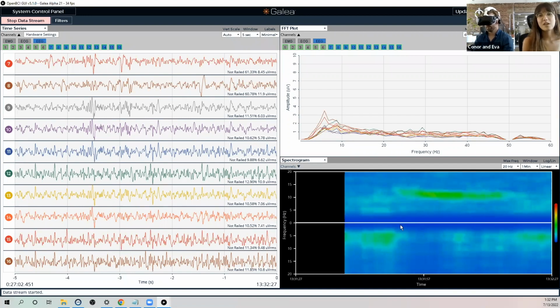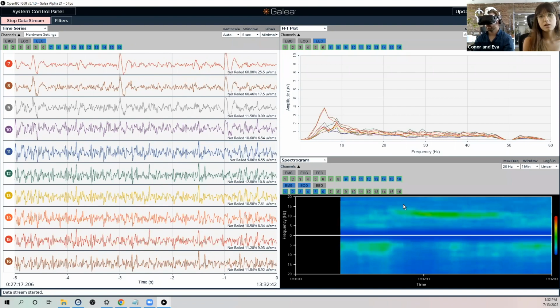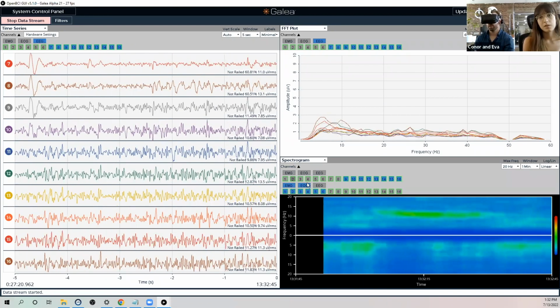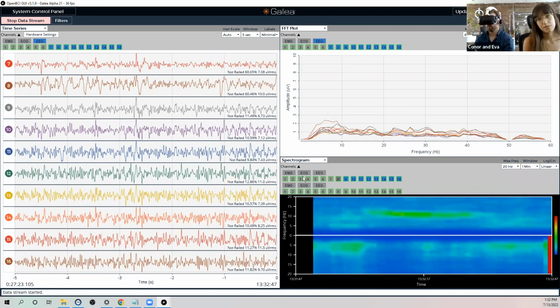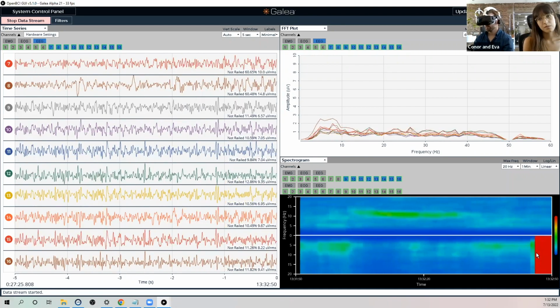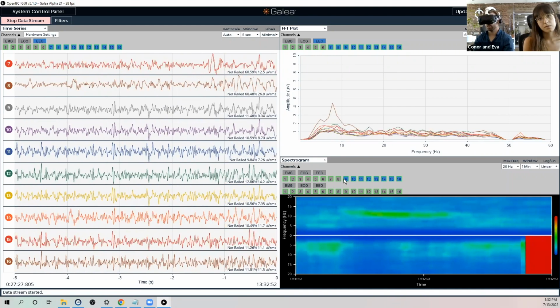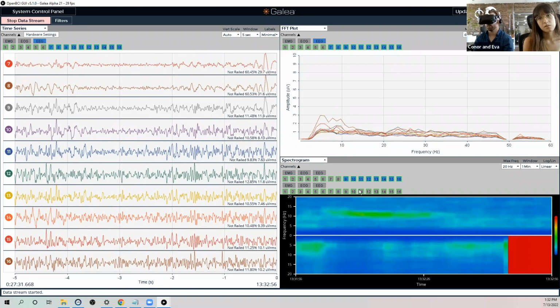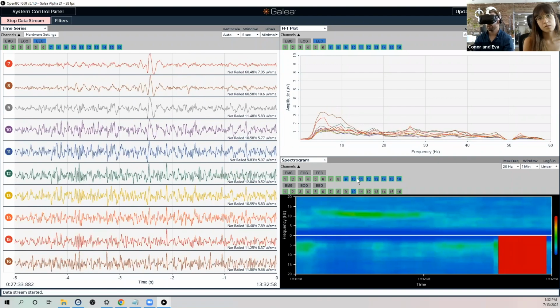Let's see which channels are in. You can see that it got much stronger in the alpha power band. Oh, I see, that's why. Whew, okay, cool. I thought I was going to have a little alpha asymmetry there. So let's just do the top channel, or the top bar. Ignore this down here, unless, actually, let's go left and right.